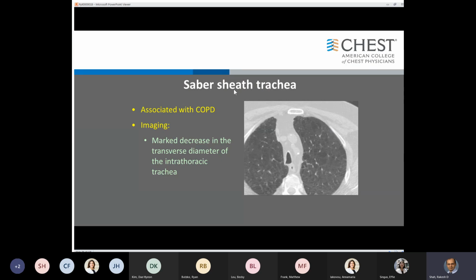Before we go to the inflammatory conditions, one thing about the airway that causes narrowing or stenosis is saber sheath, and it is just recognizing an anatomic finding that we see. As I showed you, the trachea normally is a nice round structure, but in individuals who have increased intrathoracic pressures for a long time from obstructive lung disease, as the pressure is exerted on the airway, it remodels it instead of being nice and round to this sort of elongated structure.